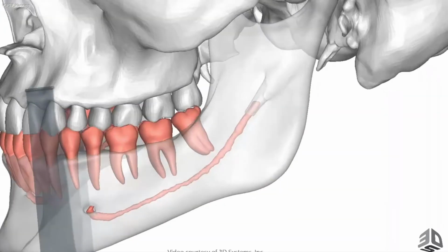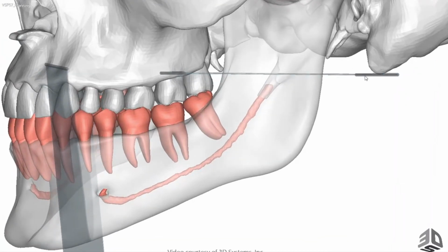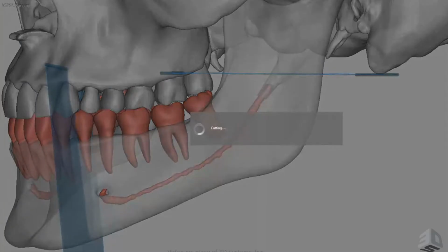And then on the posterior here, the horizontal cut. Again, I'll make a comment on this. This is not my usual go-to osteotomy. The sawbone work that I've done, the models presented were horizontal ramus cut. I would always counsel removal of the ramus when you're having to resect any of the ramus, so either a vertical subsigmoid or an oblique going up to the coronoid sigmoid notch. But for the purposes of this simulation, we're going to stick with the sawbone cut. So it's a horizontal cut as you've shown, James. Thank you. Yes. So that's the resection.